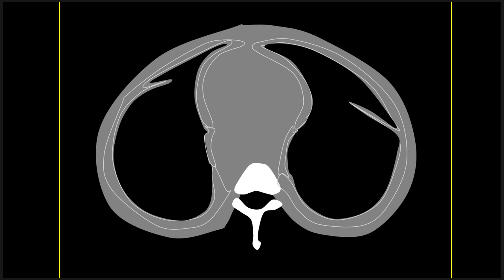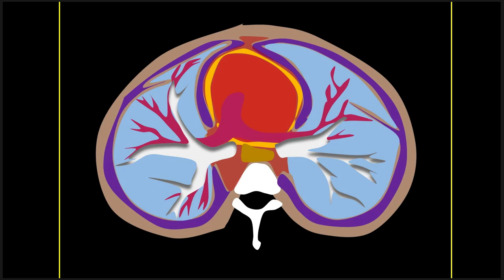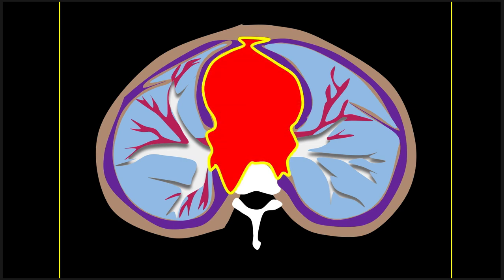Alright, this will be important later. Remember that I said that, and I'll bring it up again, of course. Alright, now, a few more things I want to point out here, just so everything is clear. So this right here, this is the mediastinum. And remember that that's going to involve the central trachea, the bronchi, the esophagus, the heart, pericardium, etc.